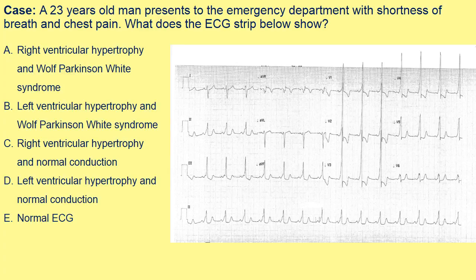Now look at your cardiac axis. Okay. So lead 2 is up, lead 1 is down. Both of them are no more positive, so there's definitely axis deviation, but they are still meeting each other, so they are pointing to each other. So there's right axis deviation. So right axis deviation, very long R waves in the right ventricular leads, and you can also see that there's inverted T waves in the right ventricular leads as well. So that should be pointing you towards right ventricular hypertrophy.